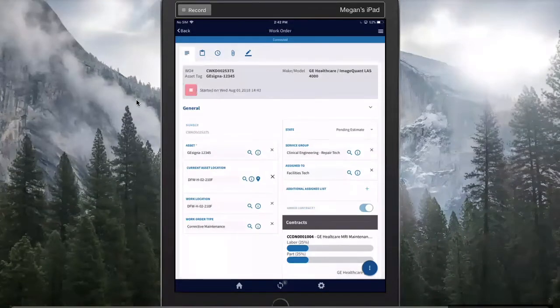This is something we'll do right away when we open a work order, because now it's collecting information on how long it is taking us to process through this work order. So things like productivity can be measured through that metric. And if I have a labor rate tied to my name, tied to my user record, we can also calculate a work order itemized cost that will roll up to that work order and also to the asset involved in that work order, so that when we go to report on things later, like total cost of ownership of this device, we have that information rolling into that.